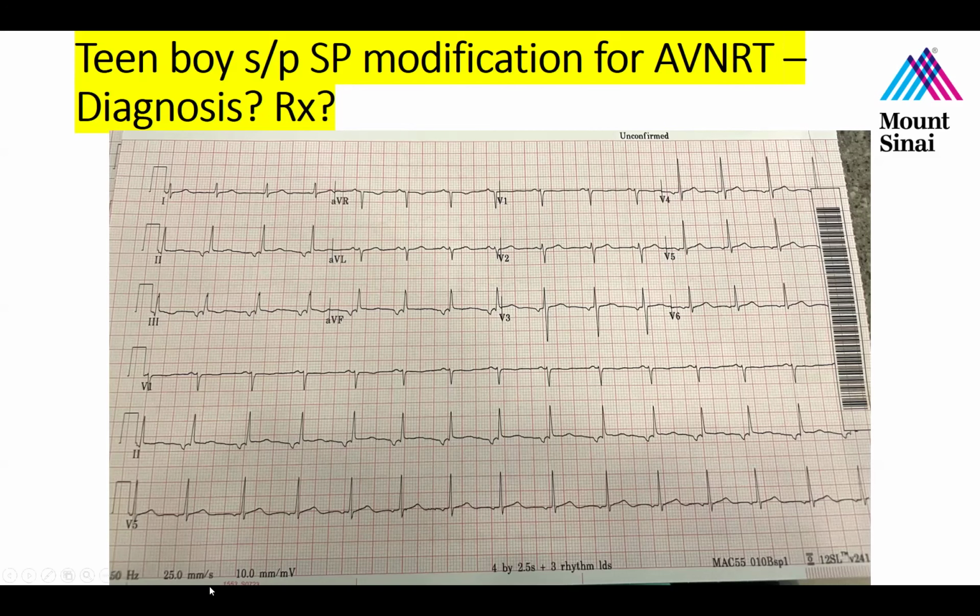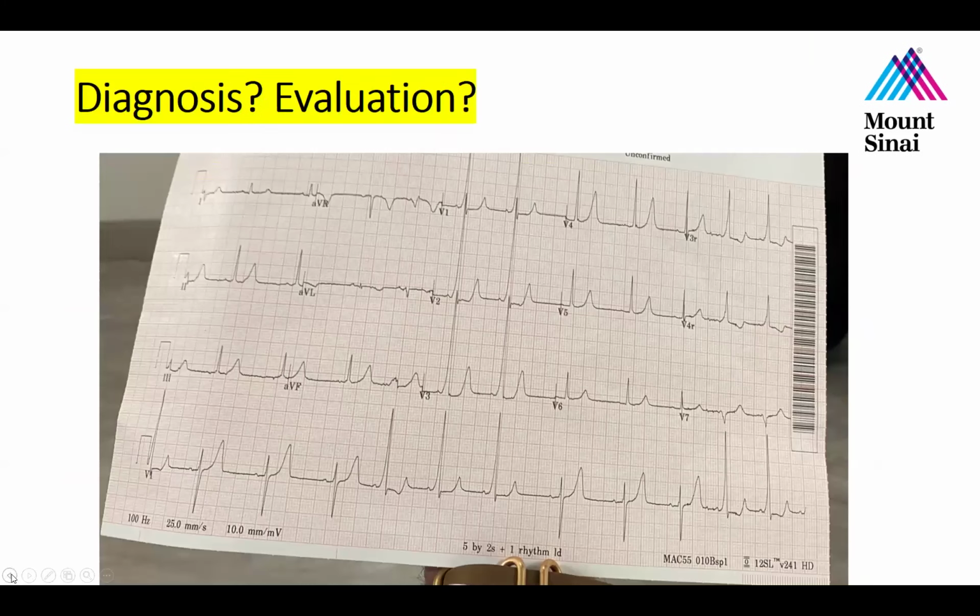Okay, let's move on to the last tracing for today. Sorry. So this was a tracing that one of my colleagues was nice enough to bring into my office and ask my opinion on. This was, I think, also a teenage girl, I believe.